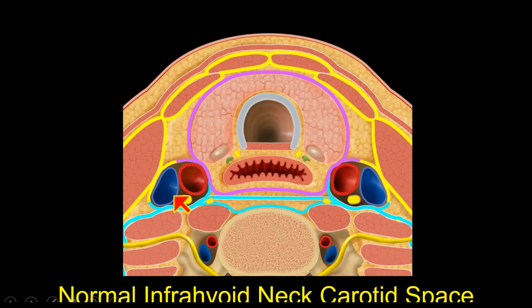So you can imagine here, if this lesion in the infrahyoid neck were a vagal schwannoma, a nerve sheath tumor, how the vagal schwannoma starts with a V. The V is like a wedge. As a schwannoma down here enlarges, it would wedge itself between the carotid and the jug in that space, whereas the sympathetic plexus fibers should push them both forward. So we think about those nerves coming down with 10 and back up the TE groove to get up to the vocal cords, different than that sympathetic plexus that we think about at a different location.